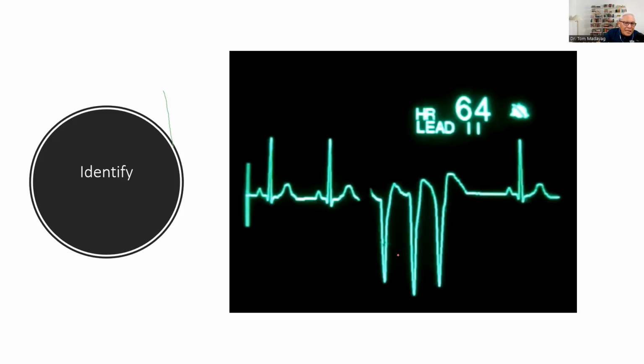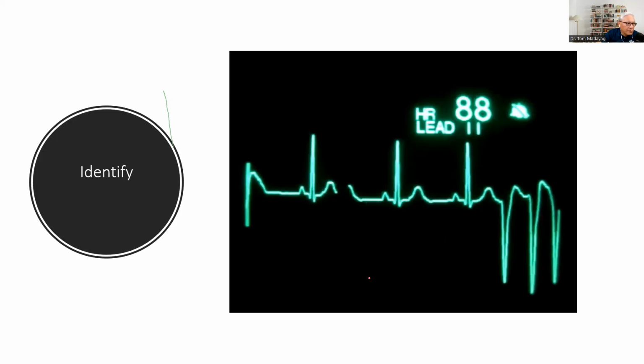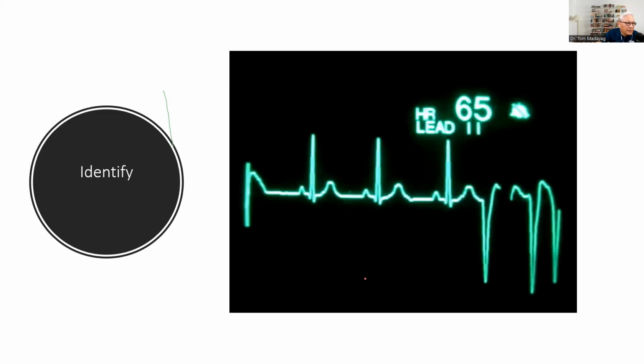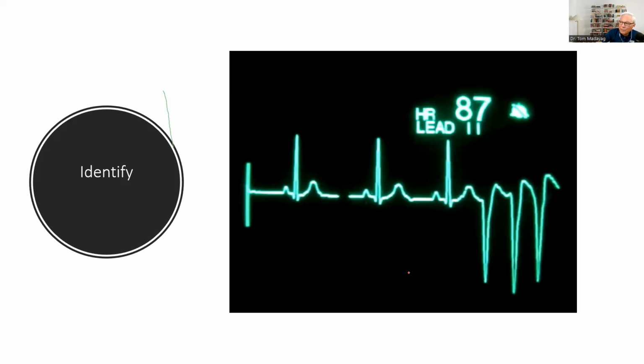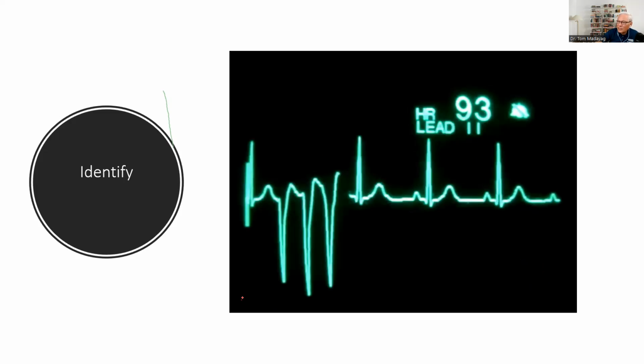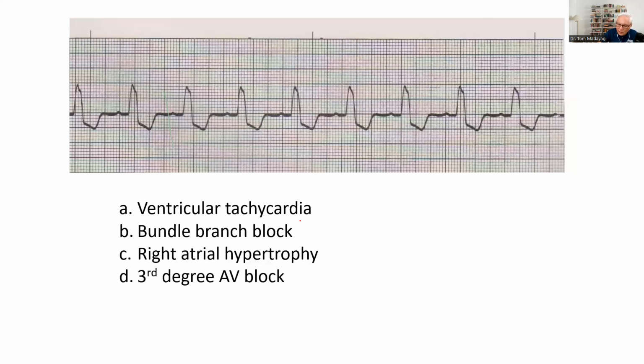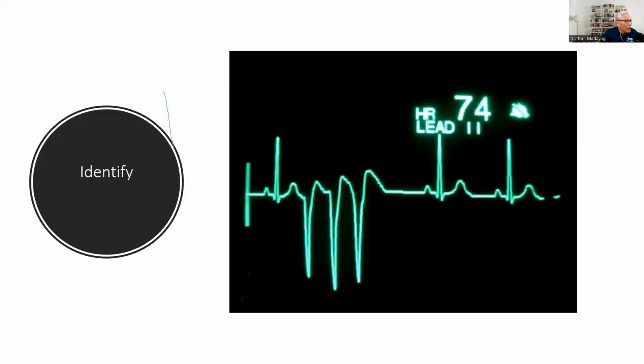We have a repeating pattern over here, wherein one type of PVC is what's called unifocal PVCs.